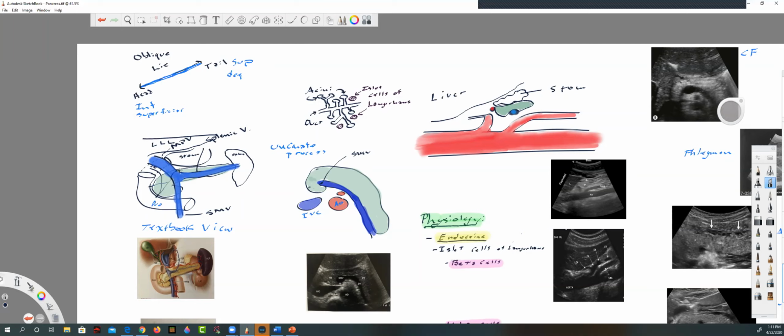it is now the confluence of the two vessels coming in. So it gets a little confusing. You might be like, well, Mr. S, you said that's the confluence. It is. Technically, if we were really closely going to look at it, it might be more SMV than confluence, but we're talking half a centimeter or less away.